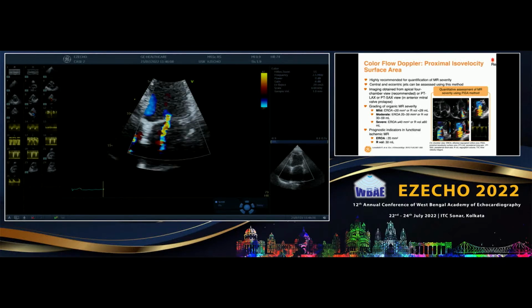Anyway, now how do you know which is the neck? Always look at the lateral side. If you see a black line going horizontally, because when the flow is going towards a hole like a sink, the flow which is perfectly perpendicular to the ultrasound beam will not be registered and will look like a black line. And you know that is the neck.